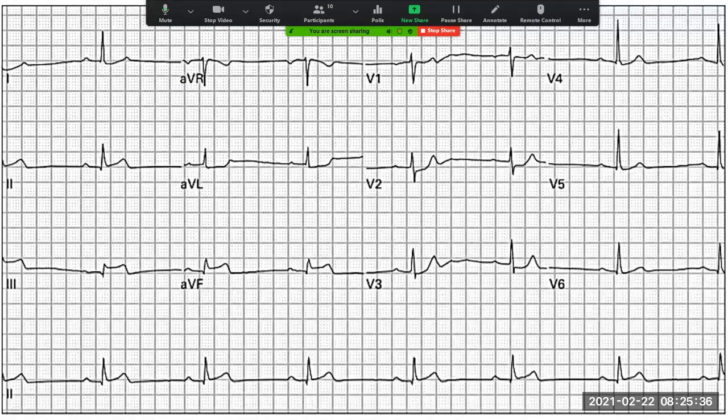All right, no problem. All right, so we know we've got a bradycardia, so our heart is going very slow. We've got a patient who's diaphoretic. We've got a patient who's got a block, which means that we keep on looking towards a heart attack, ischemia, right? Because ischemia at the end of the day means that blood supply has been interrupted to a particular part of the heart. It's a nice way of saying a heart attack. I mean, that's essentially what a heart attack is, right? I know it may sound simple, but that's basically what it is. So we know we've got all of these things.